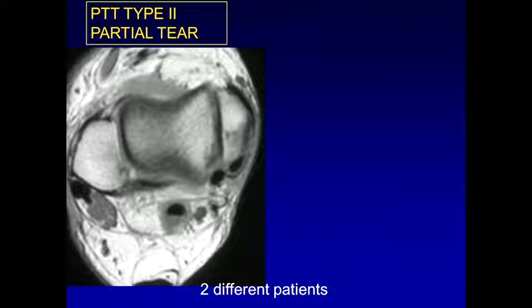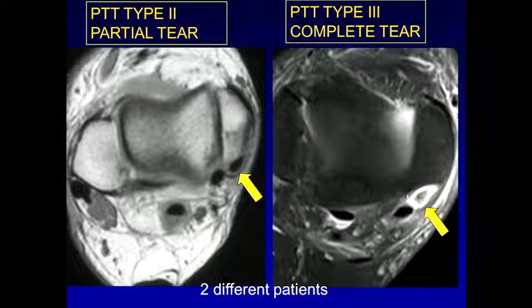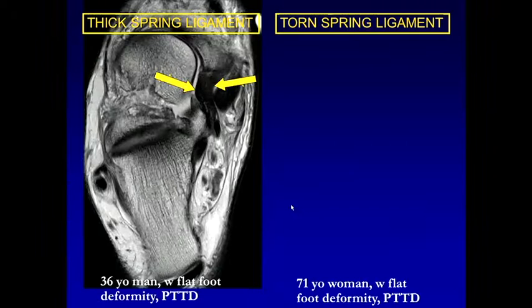This is a case where often this type of pathology of the posterior tibial tendon gets missed, and the reason for that is because the posterior tibial tendon demonstrates normal morphology and signal, but in actuality is too small relative to the flexor digitorum longus tendon. This is a markedly attenuated, elongated, dysfunctional tendon. This is a type 2 partial tear. And finally, and we don't see that commonly because these cases get picked up more early now, we see a complete posterior tibial tendon rupture. This is a type 3 complete rupture.